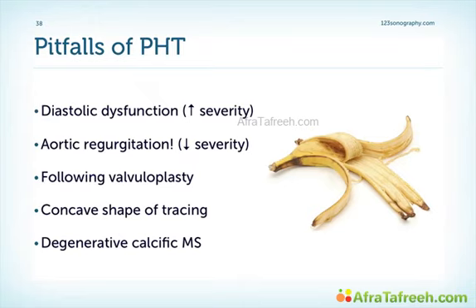Coming back to the pressure halftime, what are the pitfalls and where do you have to be careful? Well, first of all, diastolic dysfunction is not the ideal setting to use the pressure halftime. Why? Well, simply because the pressure halftime is not only influenced by the size of the mitral valve orifice, but also by, for example, the compliance of the left ventricle.